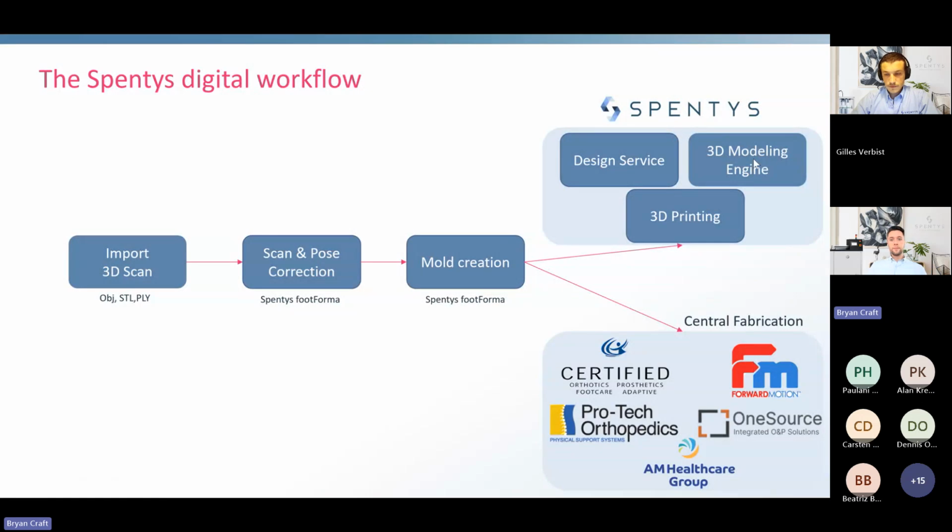And I'm going to zoom into the digital workflow. If you're a clinician or a technician that wants to leverage this software, after the mold creation step, which Gilles just showed us, you have really two routes to go. Limited, but you have two routes to go that I'm going to share with you.